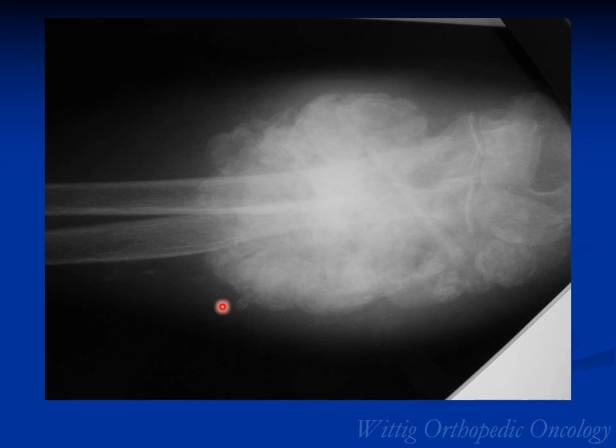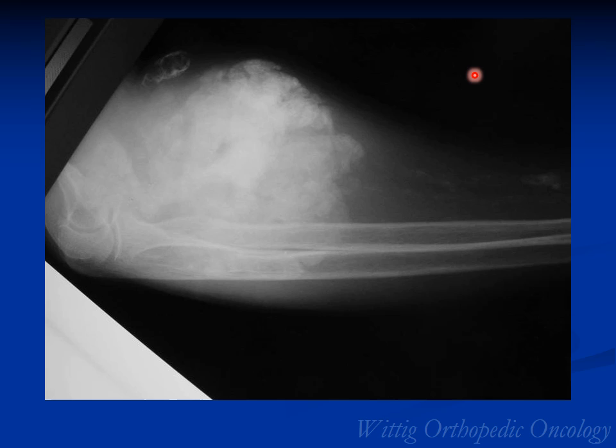Here's a good example of ossification. You can see a fluffy, cloud-like white density in the soft tissues around this elbow. This is what ossification looks like. It's fluffy and cloud-like. Here's a lateral X-ray showing you the fluffy, cloud-like ossification around the elbow. And you can see the difference between this and what is termed calcification.